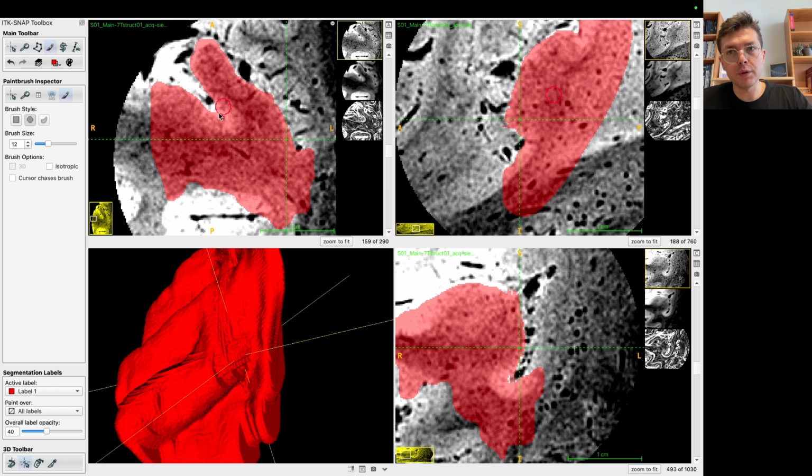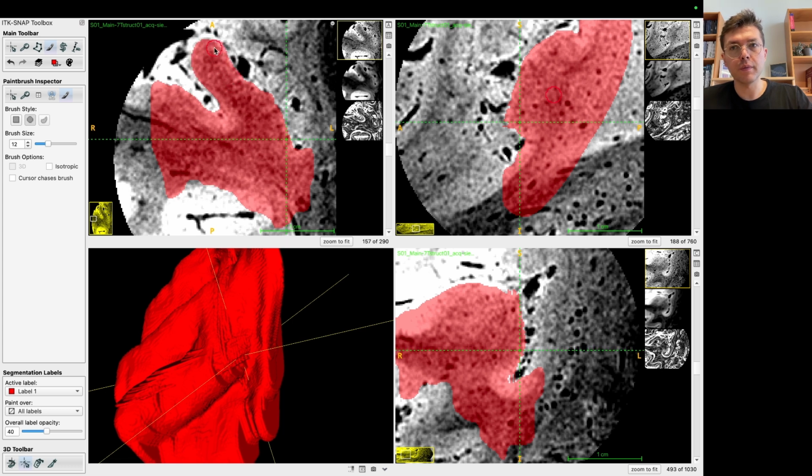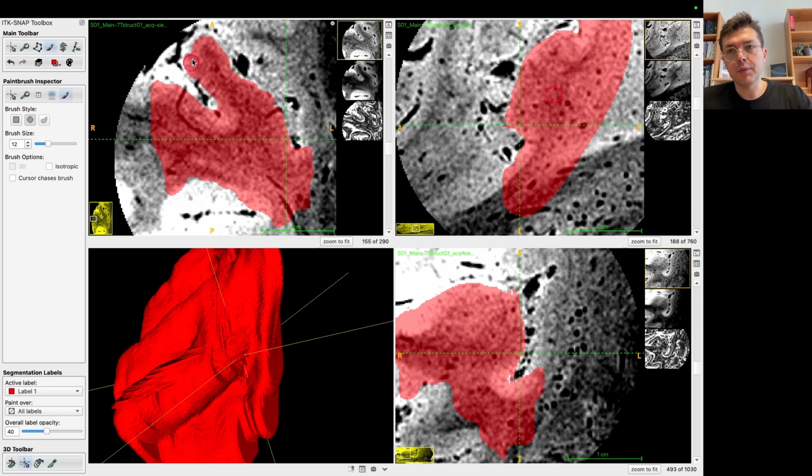And always, whenever you see this big tubular structure that is kind of sandwiched like this in between two gray matter, that's the outer gray matter boundary. They are the pial vessels. So stop there before going into them. It is not as you see it in the T1 weighted images. So definitely, if you are tuned to seeing the outer gray matter border in T1 weighted images, this will feel strange. But eventually you'll get there.